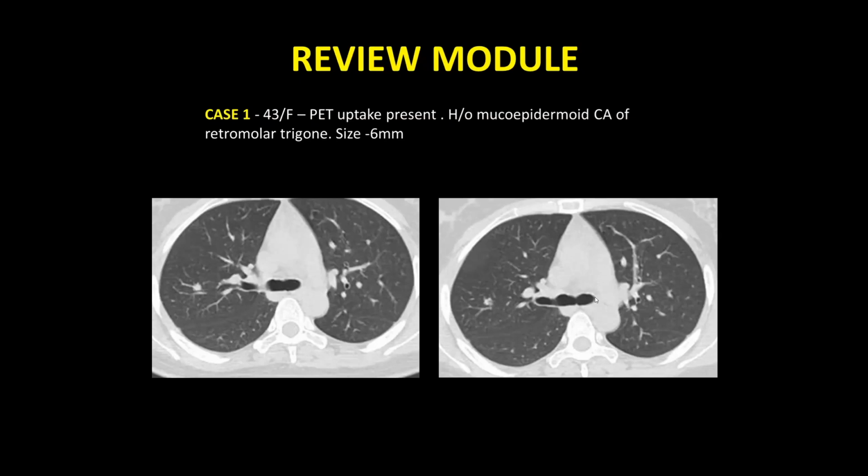Again, it was not basal. There were no other lesions, only one thing in the upper lobe. If you see the nodule morphology, it is speculate and there is some bronchus going into it. Size is 6 millimeter. It is a solid nodule, not a ground glass nodule, so that excludes atypical adenomatous hyperplasia for us. A spiculate solid nodule, yes. Invasive adenocarcinoma, 6 mm, right? Minimally invasive adenocarcinoma, adenocarcinoma in situ, metastasis, and of course, non-malignant lesions. Those are the differentials which we can consider in this patient.